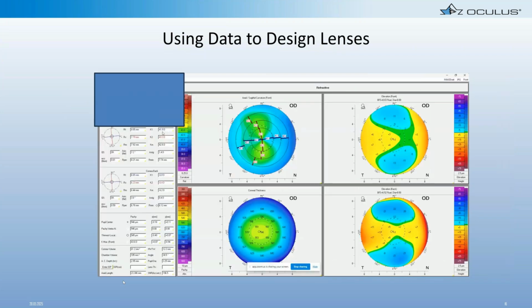So again, this is just an example of a map of a patient who might be considering Ortho-K. And the important things here, if we wanted to fit this patient in the lens, we might look at this map and say, well, it looks pretty reasonable to me. They have a little bit of astigmatism, but an acceptable level. I probably will need a toric lens because of that astigmatism. But in the yellow, we can see their K readings. So we would call the manufacturer and we would say, here's their Rx. K readings 41.9 by 43.3.